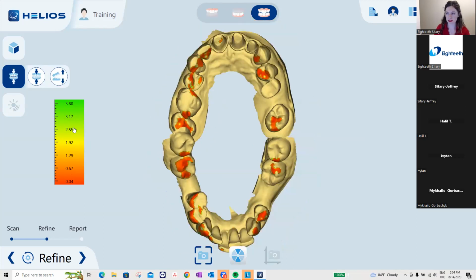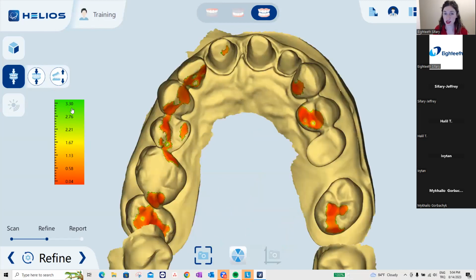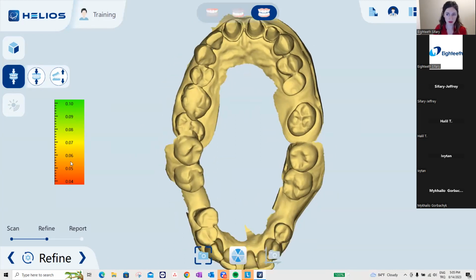And you can adjust this color by clicking this arrow with my mouse. As you see, maybe from here it will be better. You see, some colors are changing, so that means I'm changing the scale range. It's important, please explain to your doctors. Doctors can complain, I don't see the contact colors. Okay, what's wrong? Let's take a look. If the contact color is not showing anything, we need to adjust the range. Mostly, I wouldn't recommend changing it on your own, but doctors can do such things.